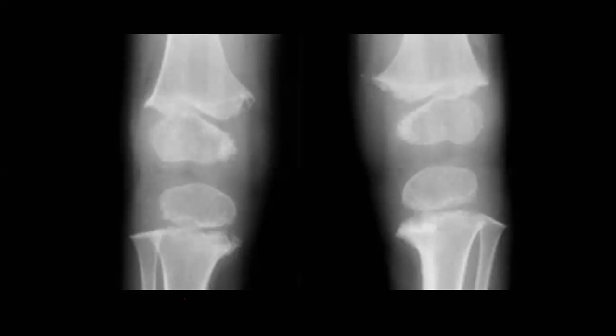It is not scary, but let's say it is not easy. But when you see this in a pediatric patient, something here in the metaphysis looks like a fracture, right? So before you go to any differential, don't forget something called non-accidental injury.